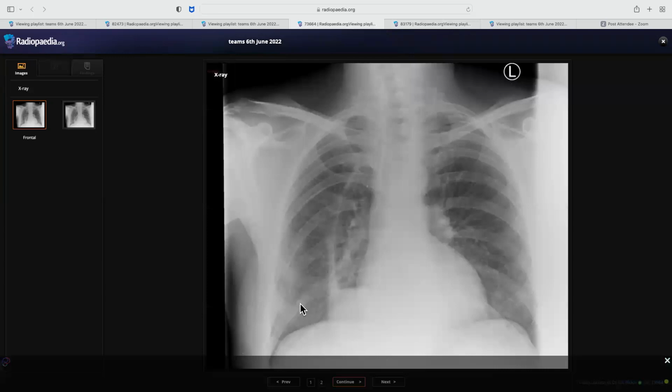And this is a case of gastric pull-up surgery. If you can see the radiograph, there are multiple rib defects here. What happens is the stomach is not seen here. You can see there's no stomach bubble. This is done for esophageal malignancy. They remove the esophagus and pull up the stomach and artificially make an esophagus through the stomach. This is that part of the stomach, and here you have that air fluid level. That's why you are thinking this is fluid which is causing it to appear opaque.